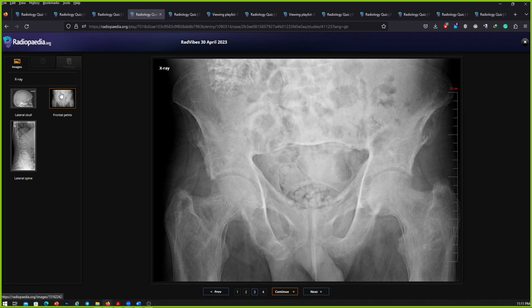And there is a lytic lesion within the proximal right femur. Where? Could you point it out to us? This is causing endosteal scalloping and there is no expansion. You have to control the screen. Which one are you referring to? No, just ignore that. That's a pseudo lesion.